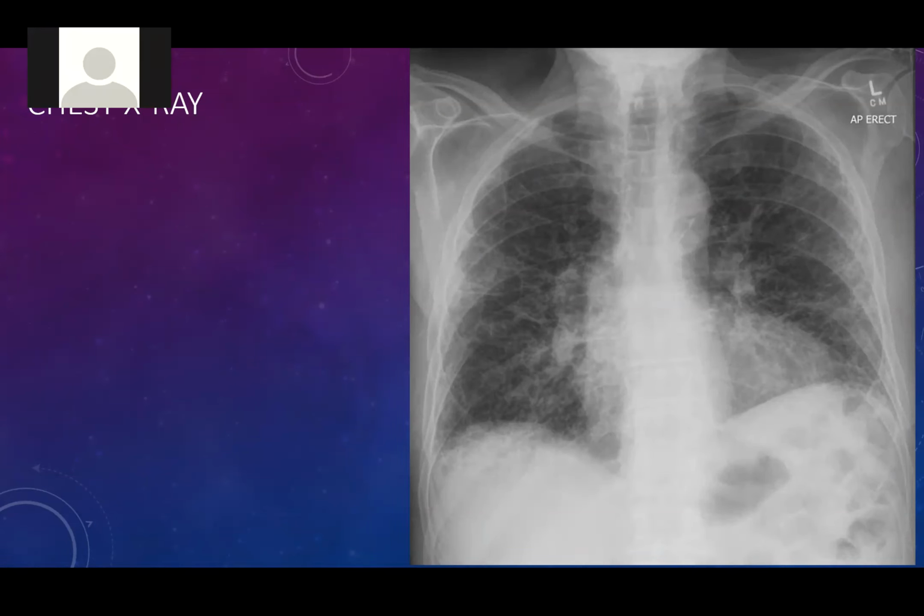Okay, for the systematic approach, I'll be starting from outside. The humerus is not showing, but the clavicles are good. The scapula is good. The ribs, I'm not seeing any fractures. For the costophrenic angles, I think they're free. For the trachea, it's showing. There's nothing obstructing it. The heart, I think it's a bit enlarged. It's big, right? Yes. It's cardiomegaly.